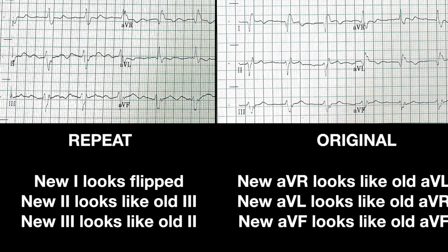This leads to our grand conclusion that what has happened here is that the patient's heart did not undergo some sudden shift in axis and something crazy happened with the electrical system, or they had some sort of huge heart infarct or something like that, especially in this asymptomatic patient. This was a limb lead reversal. And of course, we say it's suspected because I didn't actually see the guy put the leads on the initial EKG, but I did see him put on the second one, and I know on the second one that they're placed in the right way.